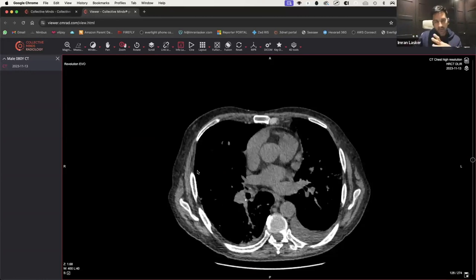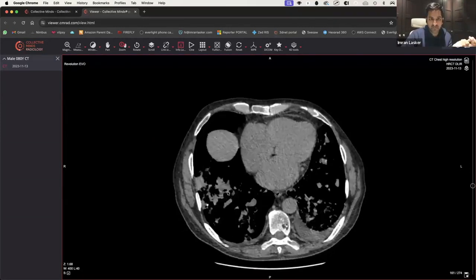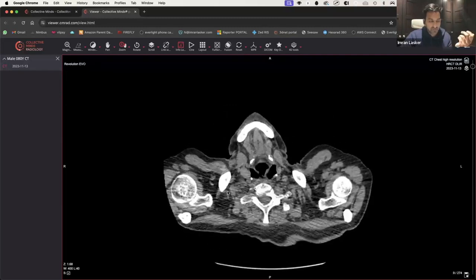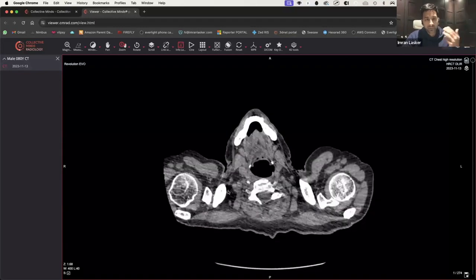So we're gearing towards this probably being infection, maybe with a background of cardiac failure, right? Because you've got bilateral pleural effusions. Also, there could be parapneumonic effusions, because someone could have effusions as a result of infection in the first place. But then also, we're all radiologists right now anyway. We have to look at everything else.